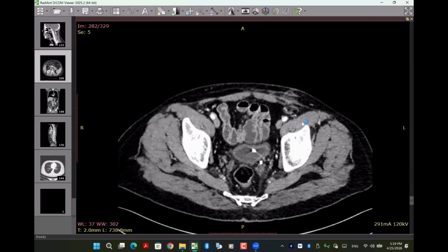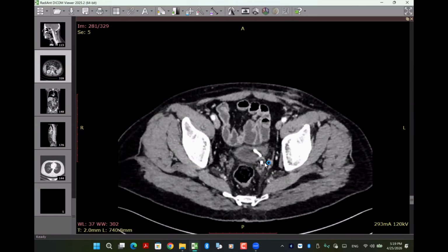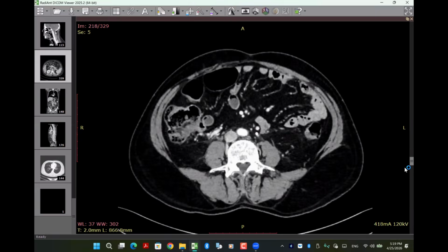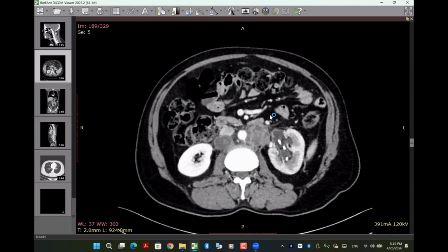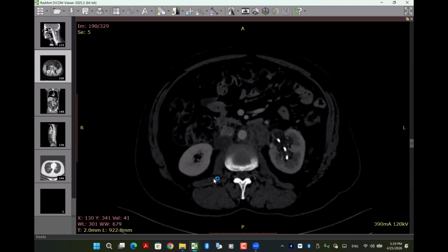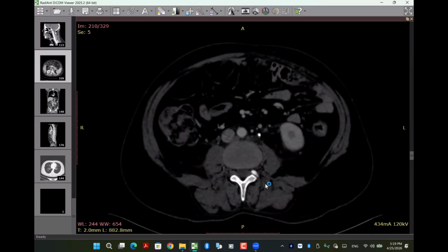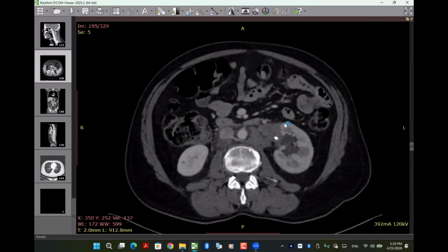Maybe it's infiltration from the gonadal vein. This is actually infiltration of the lymphatics of the scrotal wall itself. Okay, sir, you got my point? Yes. So when we finish that case, we should inform him it is non-functioning, or at least slightly functioning, with a double J catheter in place, because there is residual and there is compromise of the function. Can you see here? This is, as you say, nephrographic phase, but this is still remaining in the corticomedullary phase. The moment we see that, we know already it is an obstructed kidney. Okay, you got my point.